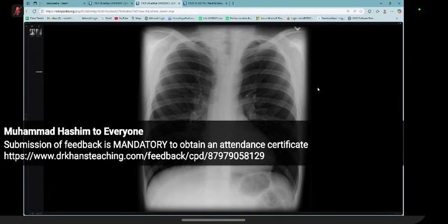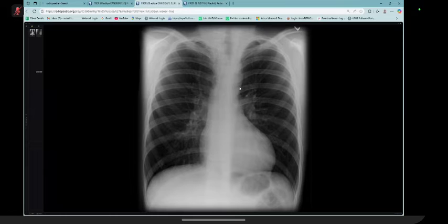All right. So you picked up correctly the inferior rib notching. You have to say that the aortic knuckle is not seen, and it was coarctation, but then you lost your way. So this kind of case will be asked where there is only one finding, and they want to check whether you are still safe and confident or not. If I were you, I could have said that in this screening film I can see that there are some inferior rib notchings.